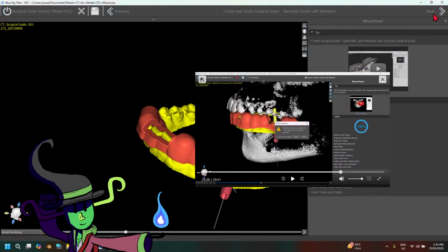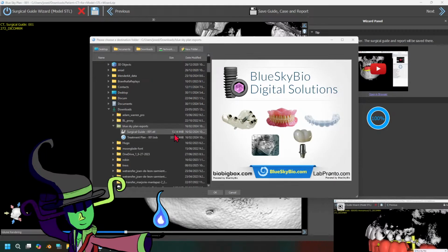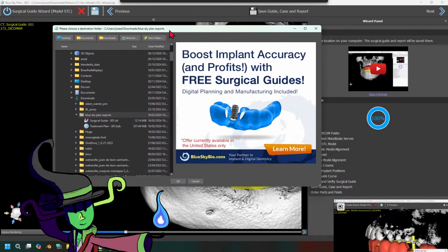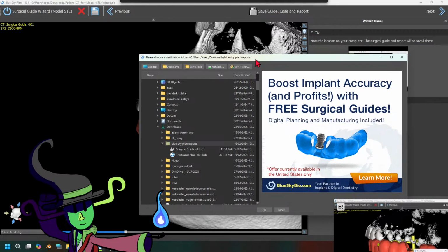Oh, wait, can I... Does it cost money though? To create... Oh yeah, it's definitely going to save this somewhere. Shit.